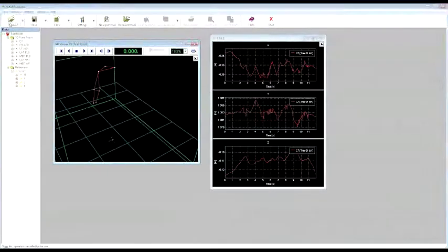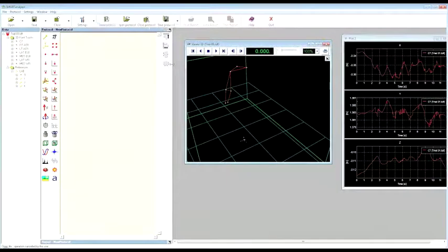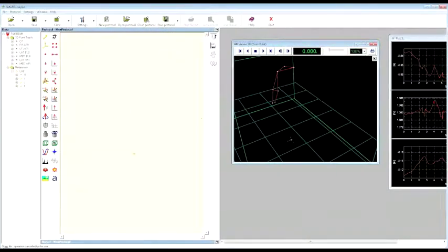From the menu toolbar, you have the chance either to open a protocol that already exists, or to create a completely new one. To start from scratch, we are now going to click on a new protocol, and as you can see, we will have this white and empty page in which we can start to add all the desired tools useful to get the results of our analysis.